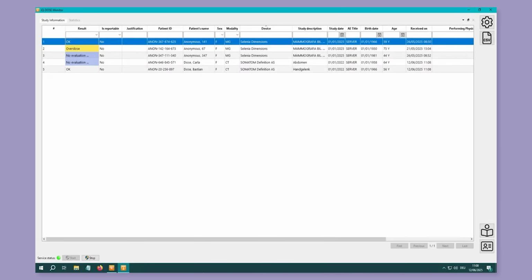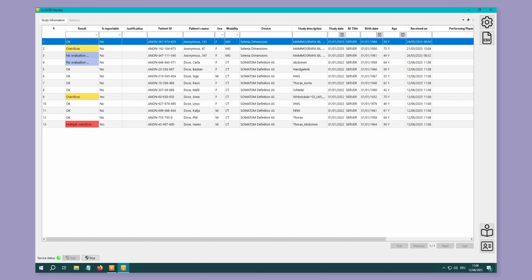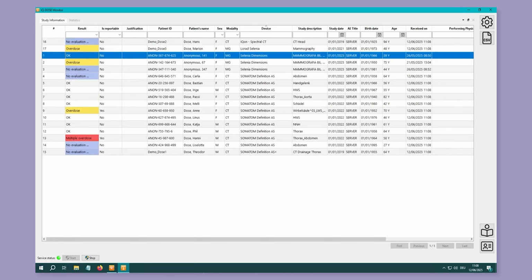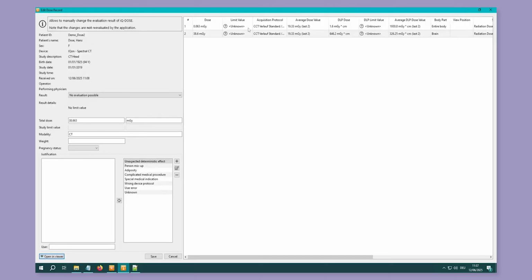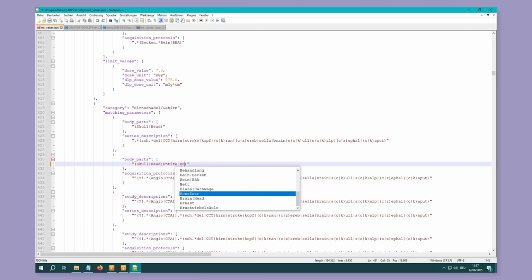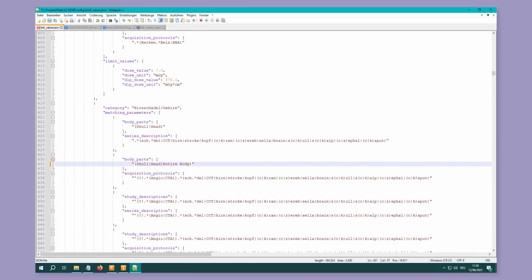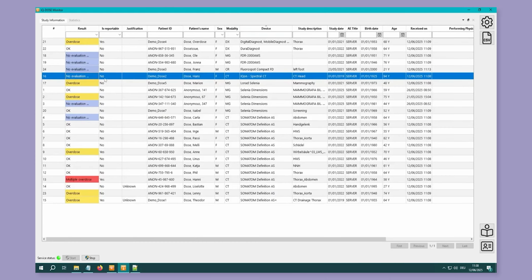The software automatically collects and evaluates structured dose reports from imaging devices. And now, it does even more. If a body part wasn't mapped correctly, because your config didn't include the term, iQ-DOSE couldn't re-evaluate the DRL assignment after updating it. Now, with version 2.0, just right-click the updated dose record and select Re-evaluate. The system instantly rechecks the DRL category based on the new data, saving time and eliminating manual reassignment.